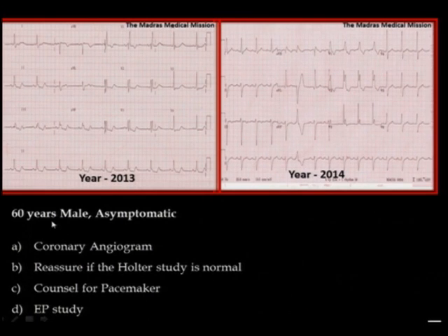This 60-year-old gentleman, when he attains his 61st year, undergoes another health checkup just to keep himself fit and be knowing that everything is all right. So this is again an asymptomatic status wherein you see some changes in the ECG. I will bring your attention to the widening of the QRS, but still resembling right bundle branch block, with a PR a little longer than this, attaining almost 200 milliseconds, with a conspicuous change in the axis towards the left side. So with this history, are you going to ask him to undergo angiogram?